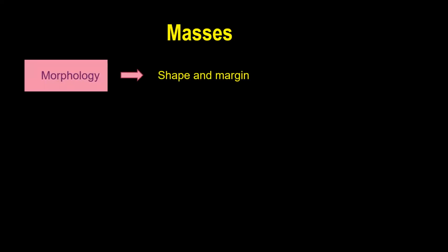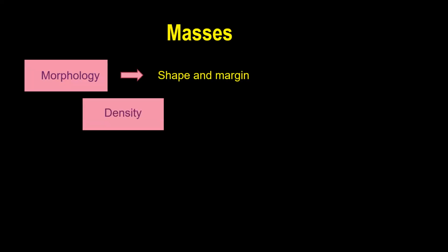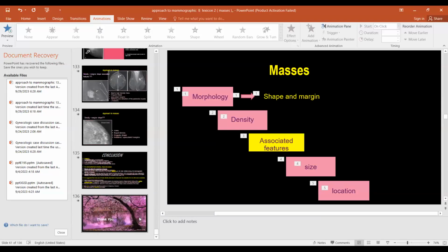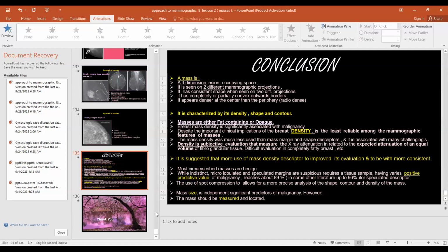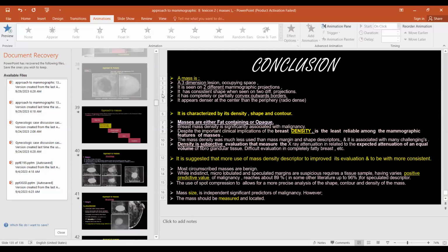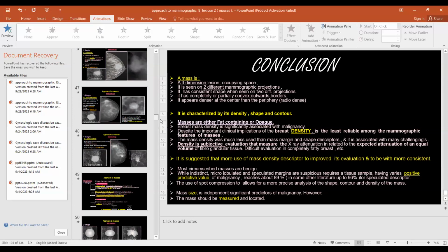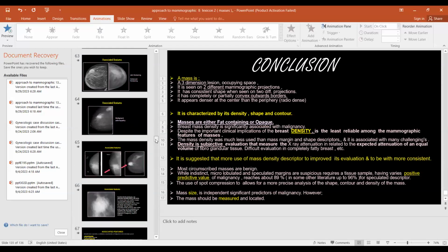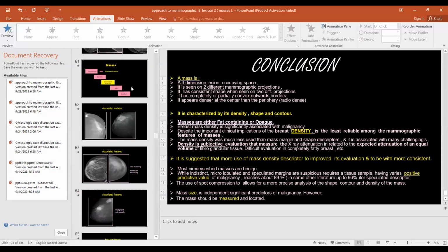So the mass we went through okay, give me 1 second. I want to check something. Okay. I don't know if I miss some of the image or the orders of the image. Okay.